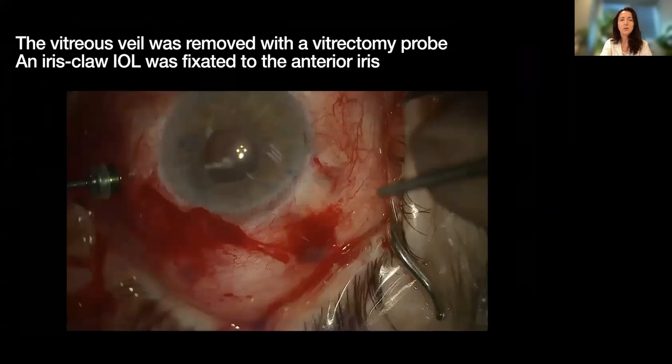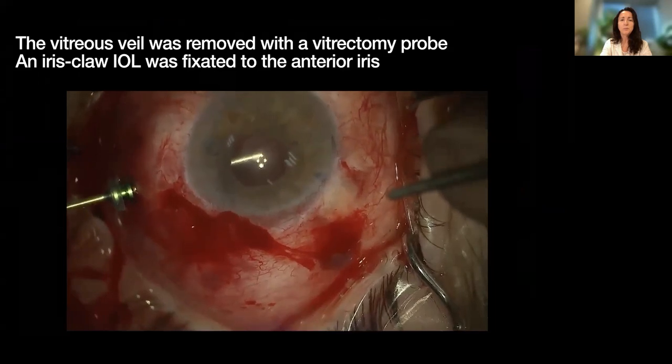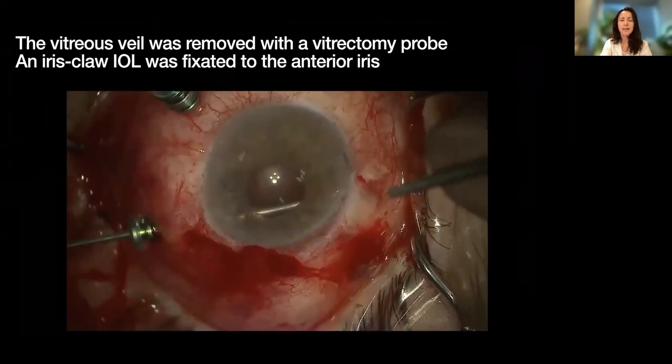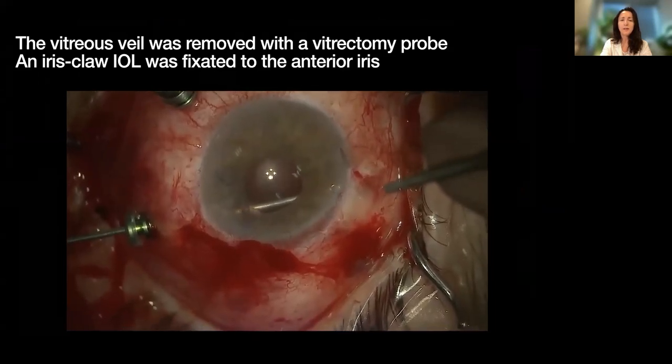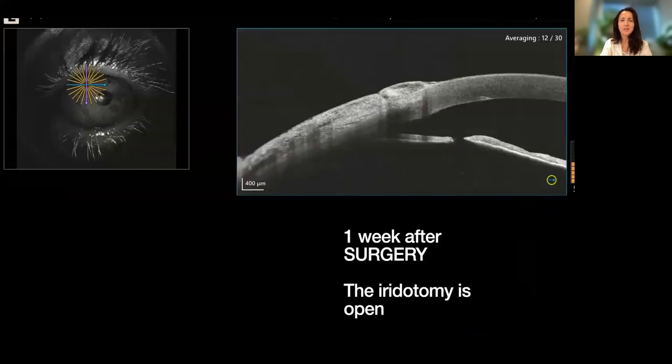So I took him back to surgery to remove those layers in the pupillary field and to reopen the iridotomy. I also implanted the lens, and the eye looked good. So it really guided my surgical decision.